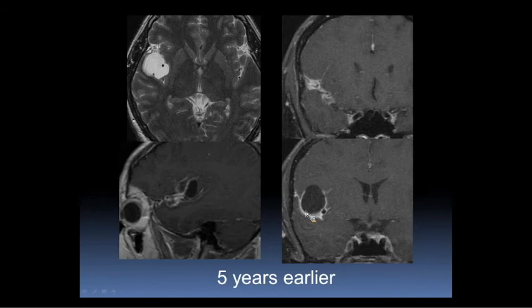And this was a patient 5 years earlier. They had this big cystic lesion, and you can see this kind of enhancement here. This was a racemose variant of neurocysticercosis. So this basically involves the basilar cisterns. There was all this inflammatory enhancement in the basilar cisterns, and the lesion itself surrounded the MCA vessels in the sylvian fissure.